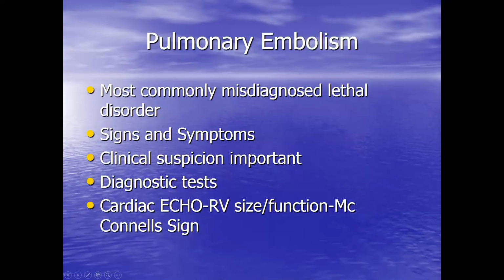It's a very common disorder, especially in hospitalized patients, that can be underdiagnosed. And we can often have echocardiographic clues as to its presence. Sometimes we see stress echoes that are referred to us in somebody with chest pain and shortness of breath that actually are pulmonary emboli that have been missed, and we can pick this up by these very important right-sided features with preservation of right ventricular apical function.